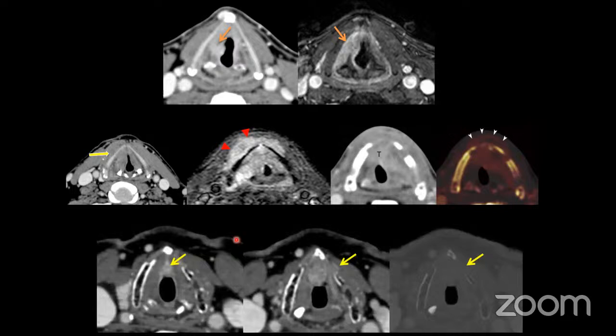Sometimes we get patients referred from another hospital, and we have a time interval between the scan and the follow-up scan by the time the patient has reached us. So remember, in anterior commissure disease, the review shouldn't happen in patients who have had scans more than 4 weeks ago, because these small volume diseases can be very notorious to involve the cartilage early. If you have a scan which is more than 4 weeks old, always request a fresh scan to stage the disease. As shown in this case, with a scan delay of around 6 weeks, you can see the volume of the disease has marginally increased, but there's cortical erosion and destruction of the cartilage by the time the patient was rescanned.